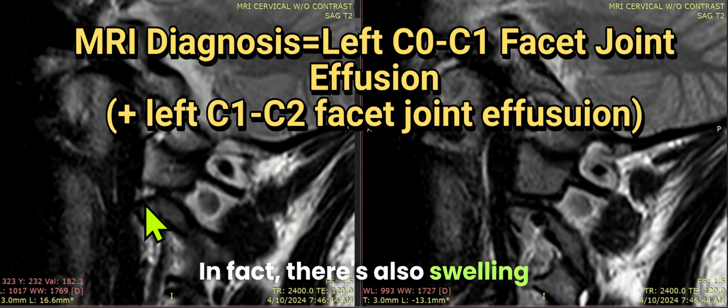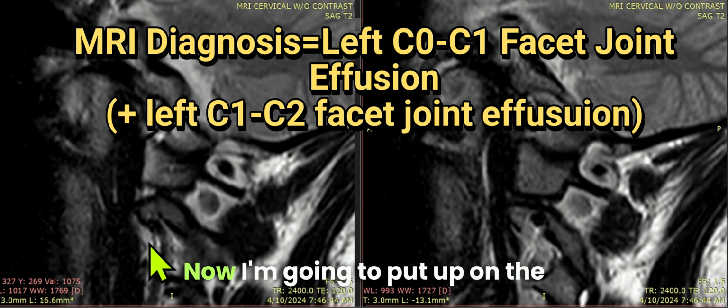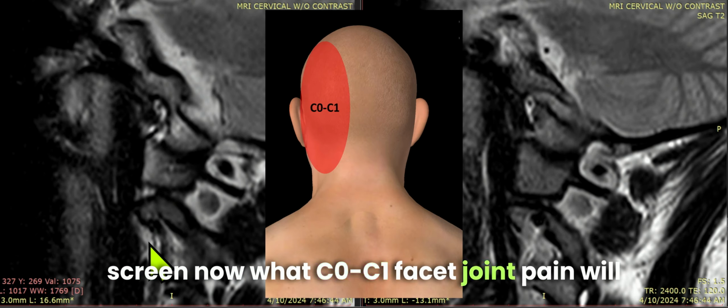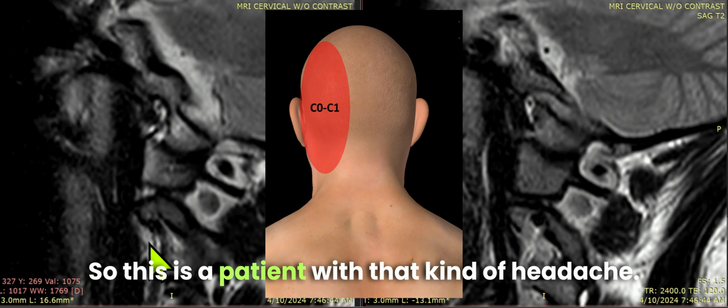In fact, there's also swelling. You can see it here. If you compare the white stuff here versus there within the C1-C2 joint. Now, I'm going to put up on the screen what C0-C1 facet joint pain will produce as far as a headache is concerned. And so you can see that. So this is a patient with that kind of headache.